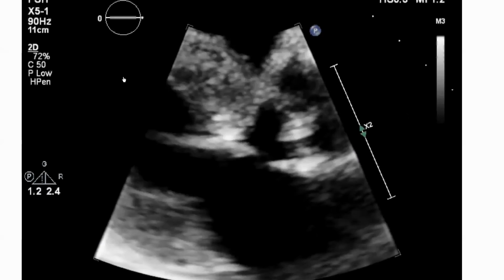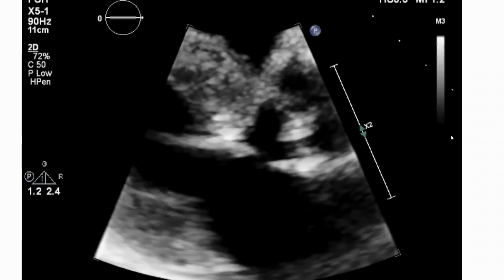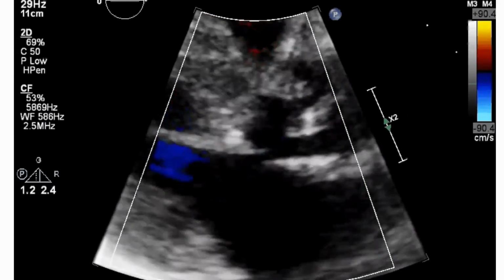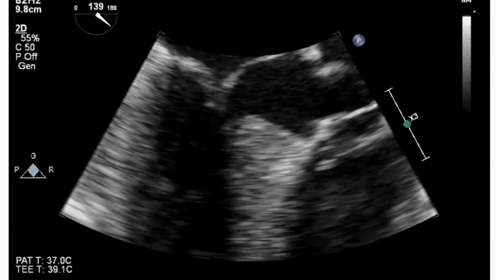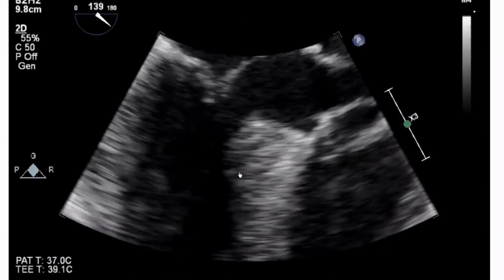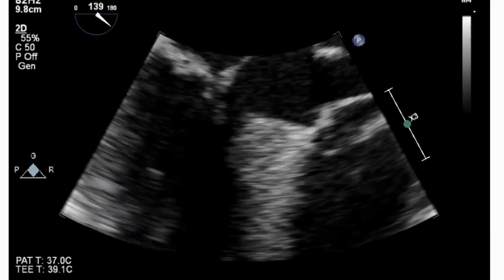And you can see that here it sort of comes down to a tip, and you can see there the chordae and the base of the mitral leaflet has a tendency to hit against it. And here there's some turbulence and MR. And here's the TOE view of someone similar. Again, there's that nice sort of bulbous sigmoid septum. So it's a fairly classic appearance.